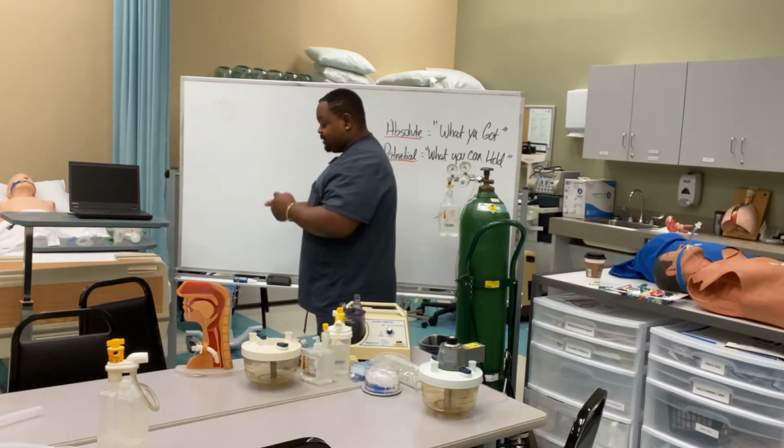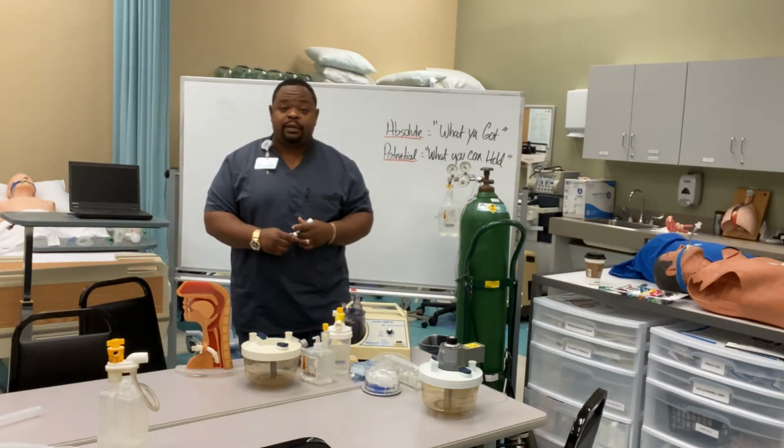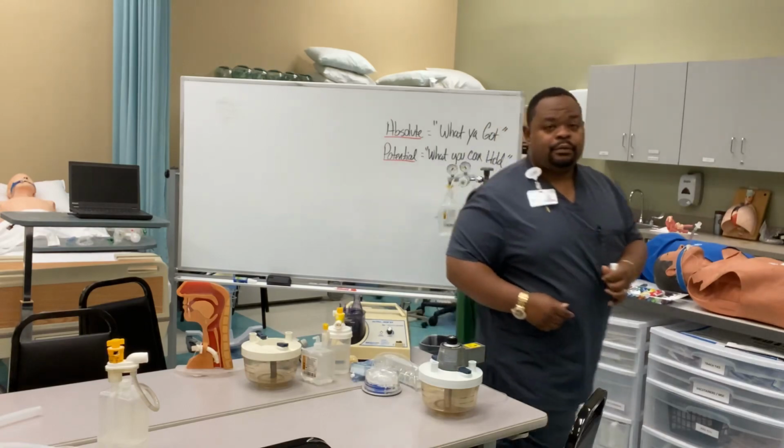Ultrasonic nebulizer boasts that 90% of their particles will be between 0.5 and 3 microns.